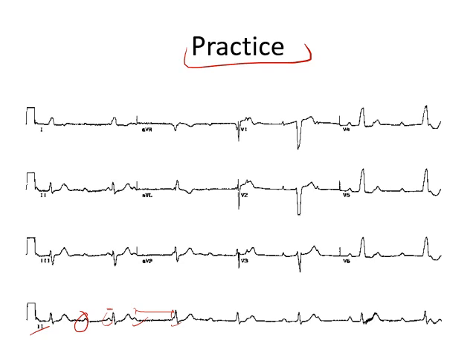And this is one more P wave and this is a QRS complex. So this is a PR interval till here. Then there's one more P wave right here that is superimposed on T wave that again doesn't get conducted. Then there's one more P wave and this is a PR interval. So you guys can notice that in this case PR interval is constantly changing. There's no one value of PR interval.